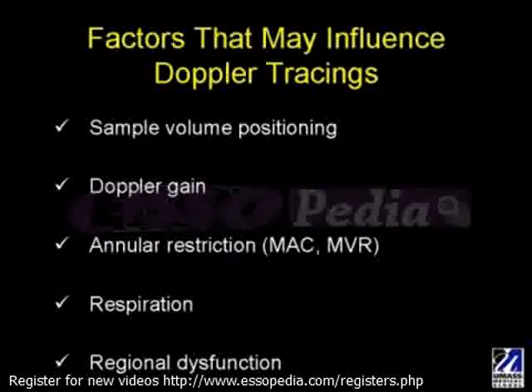So now let's talk about the factors that may influence the Doppler tracings. First is the sample volume positioning. Second, the Doppler gain. Third, annular restriction, either due to mitral annular calcification or MAC, or mitral valve replacement or repair. Respiration, regional dysfunction, and importantly, color DTI.